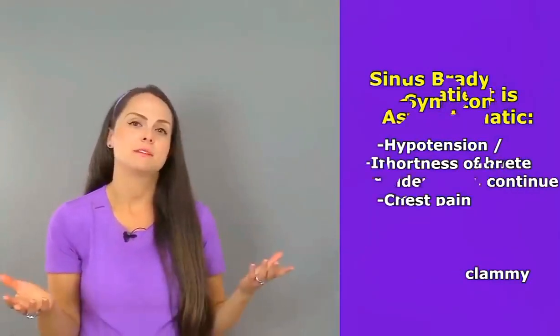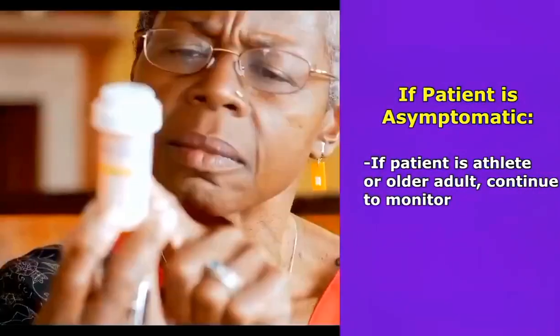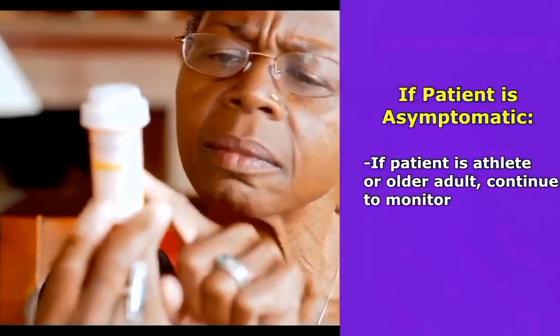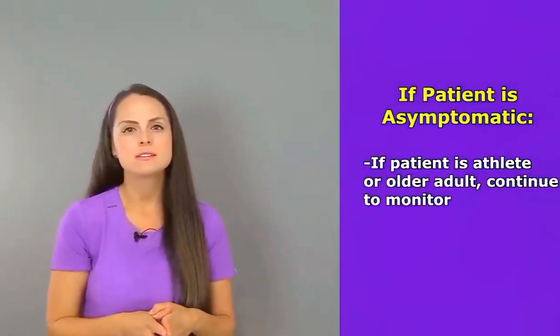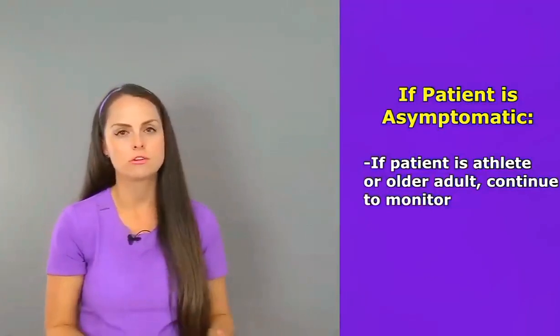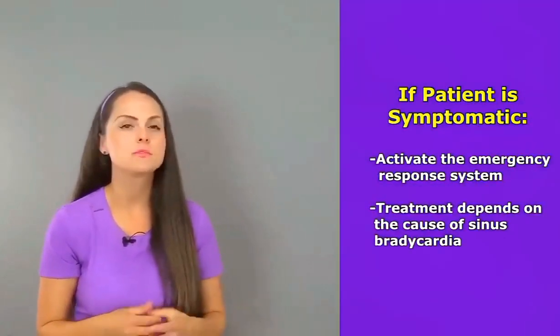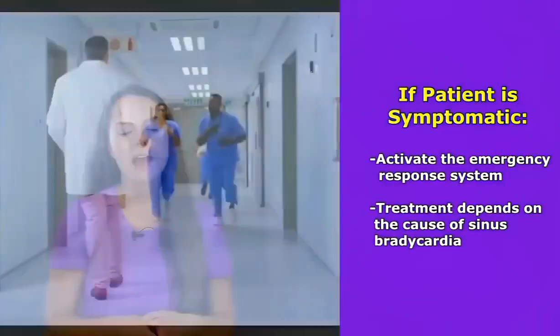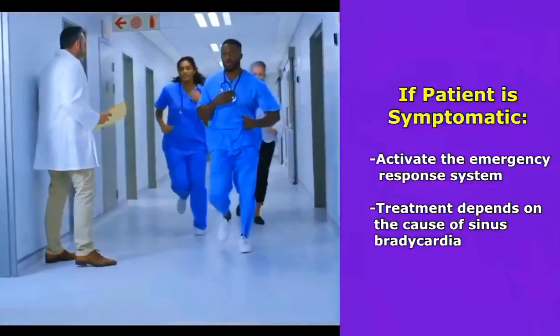But if they're not having symptoms, like let's say they're a well-conditioned athlete or they're an older adult who's just had their SA node age, so they beat at a little bit of a slower rate, usually in the 50s, and they don't have signs and symptoms, you just want to continue to monitor them. But let's say you have that patient that's having signs and symptoms. What do you want to do? Well, you want to activate the emergency response system wherever you're at and get your patient treatment.